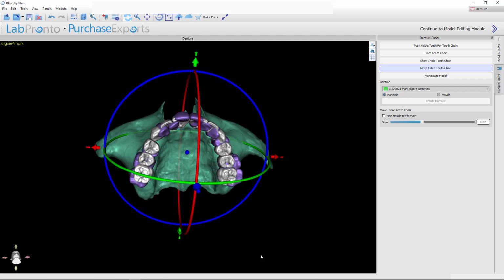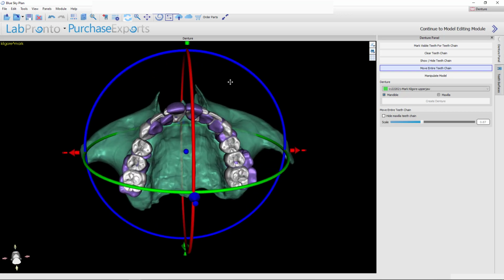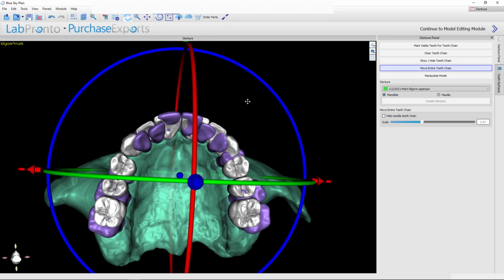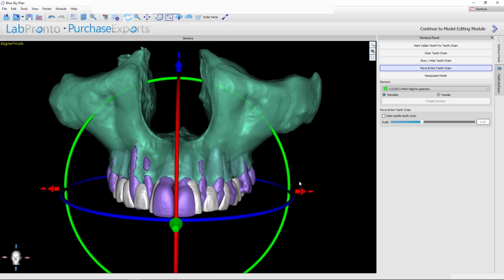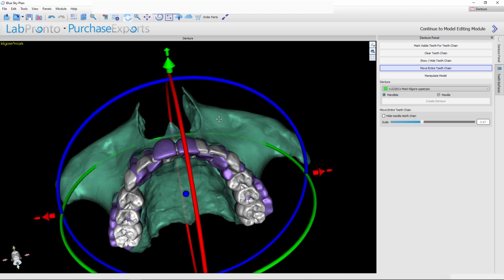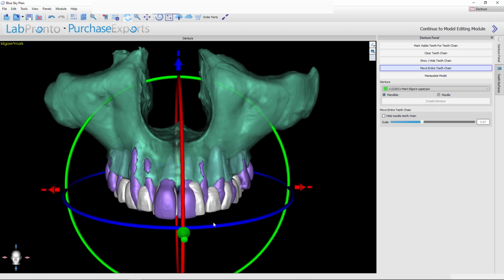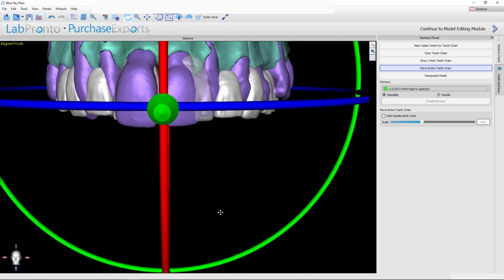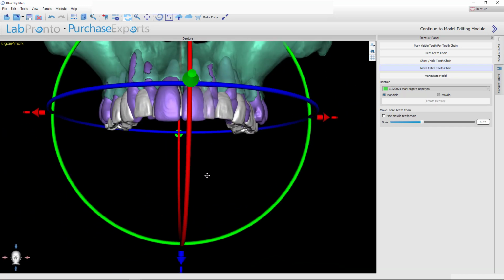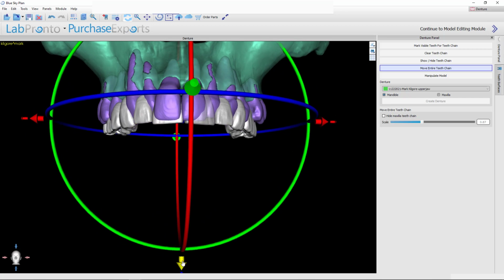Now, I don't get too bent out of shape over matching these molars exactly. I really am more concerned about scaling these anterior teeth. Okay, so again, back to my mental notes, his midline is going to be about right there. Okay, and I've toggled the transparency of that individual tooth. All right, now again, think back to what we just saw on the width of that tooth.